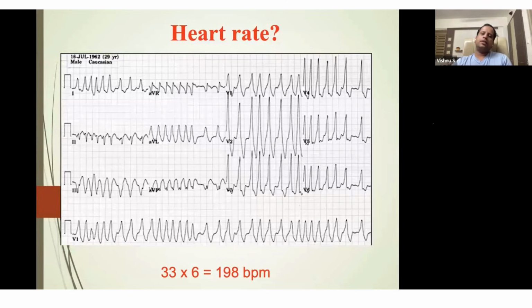And this ECG, this is the atrial fibrillation with the pre-excitation. It's a very interesting ECG actually. It's an irregular wide complex tachycardia. Usually ventricular tachycardia will be regular wide complex tachycardia. This is irregular tachycardia. This is pre-excited atrial fibrillation. This can degenerate into ventricular fibrillation.